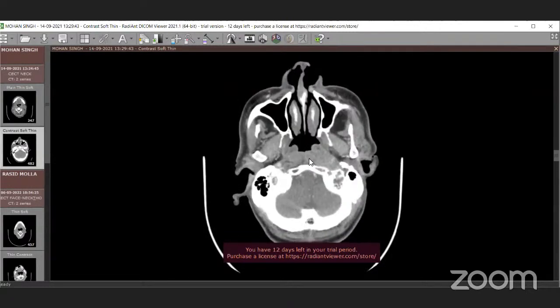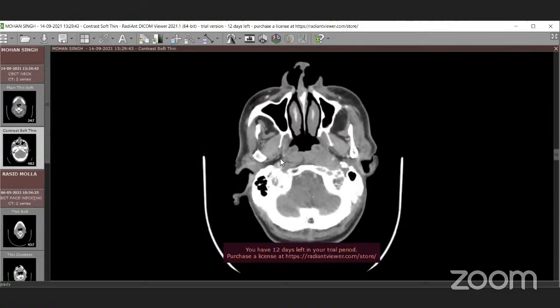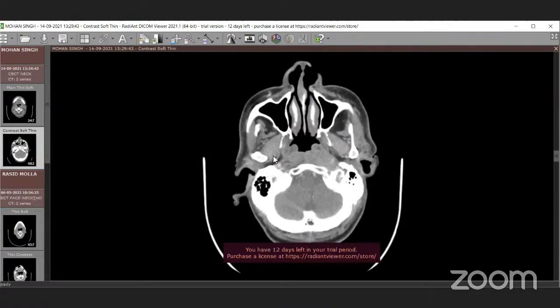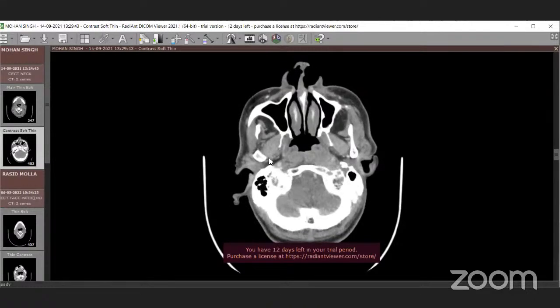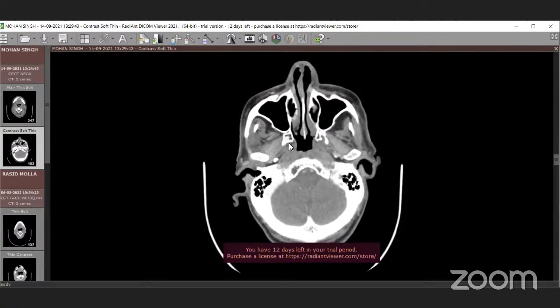Sure. So this is the pterygoid muscle, the lateral pterygoid muscle. Inferiorly, this is the medial pterygoid muscle. As we go behind the lateral pterygoid muscle, you can see some frill-like structure here. This is between the mandible and the pterygoid process, as well as the medial pterygoid hamulus.